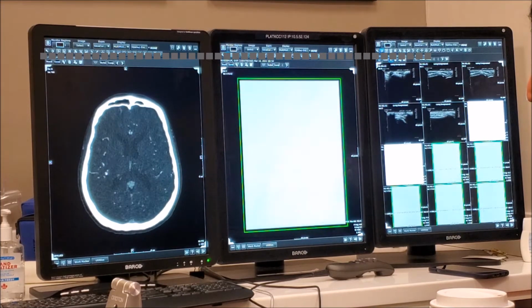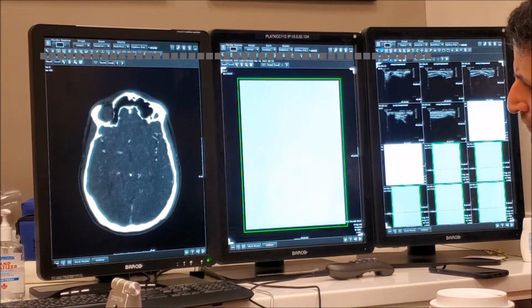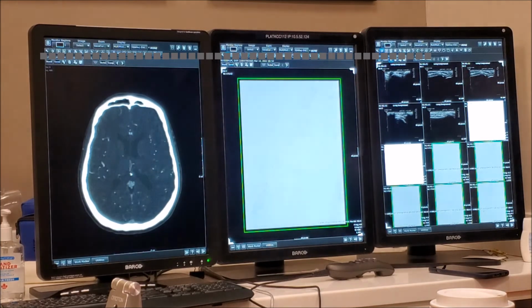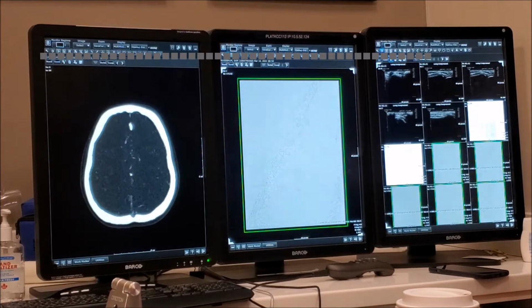And there's hypervascularity here. So that was the reason. The reason for the angiogram was to rule out an AVM in the right temporal region. Mhm. And also in the deep venous system, you have something.